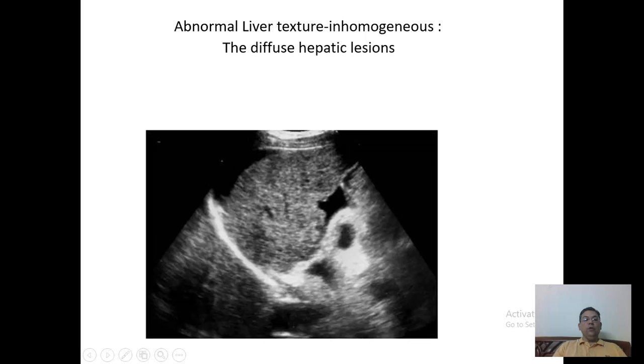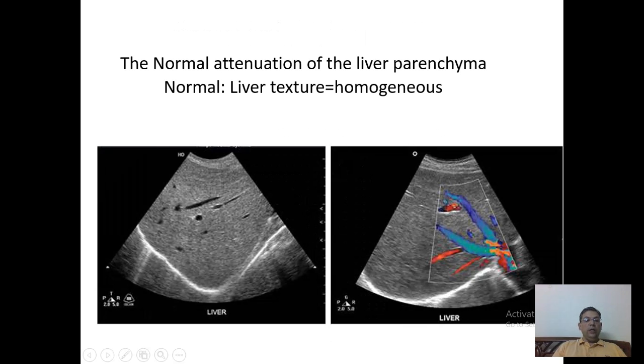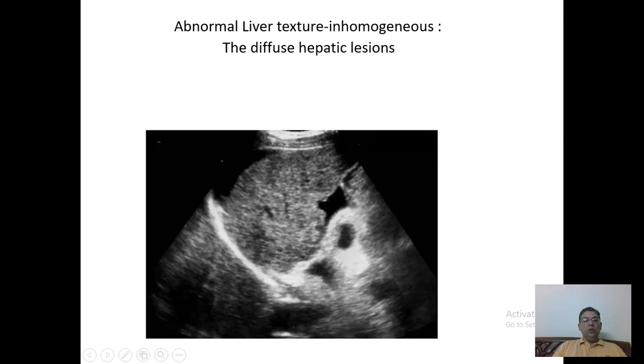There are different types of texture in different areas. And similarly, when you look here, look at the capsule, look at the line which is smooth, which does not have any breaks and which does not have any alteration in its thickness. Whereas look at this capsule, it is different, it is not straight, it is curved at some side, it is thick and all. And then these black areas we'll talk about ahead also. This is actually the fluid which is surrounding the liver, the ascites which is formed.